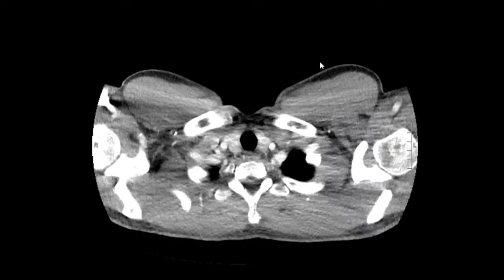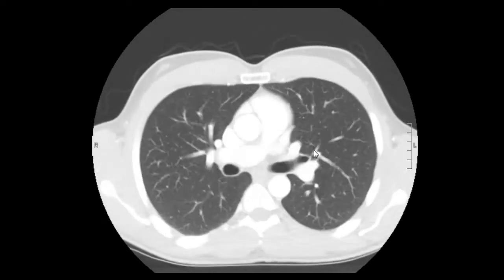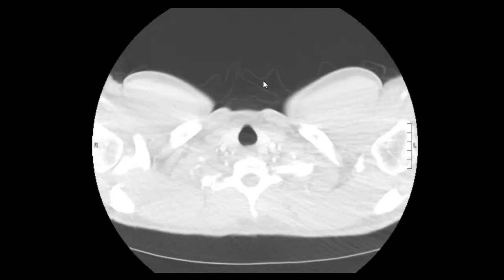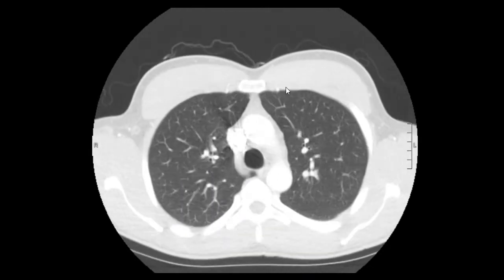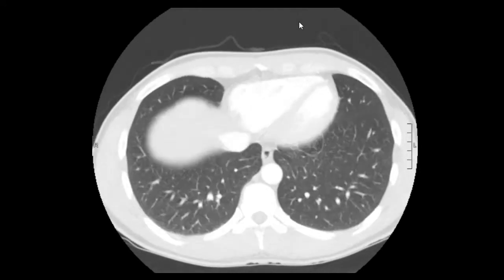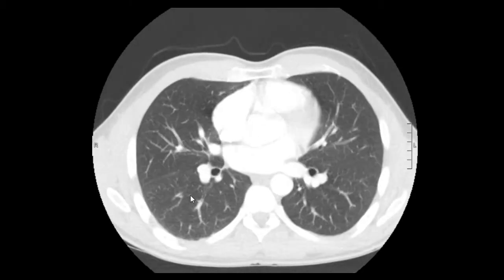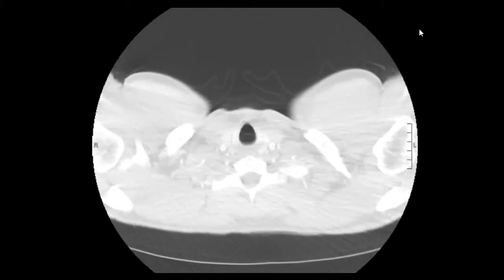Everything looks pretty normal. We're going to switch into the lung window, and I'll look through the trachea and just briefly along the more central airways to see if there's any kind of obstructive lesion, and I don't see anything. I'm going to evaluate the lungs now. First I start off on the right, looking anteriorly. And then along the right lung posteriorly, and I'm looking for any kind of pneumonia or infiltrative process or any fluid or any kind of abnormal soft tissue structure.